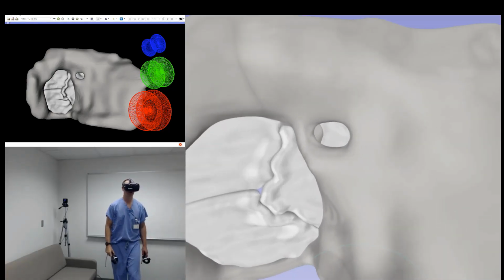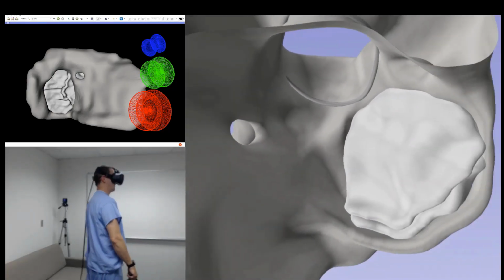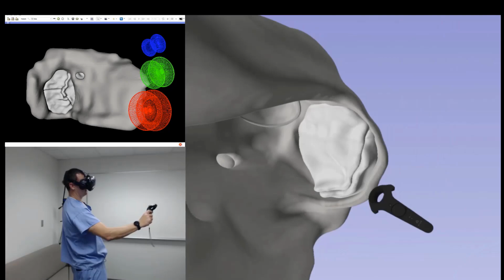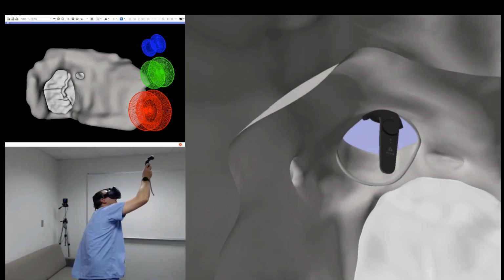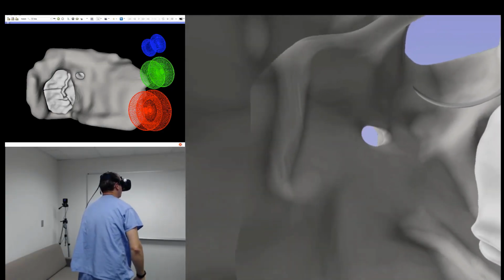We then move to the left ventricle and identify the leaflets of the mitral valve, the left ventricular outflow tract and the aortic annulus, and the ventricular septal defect.